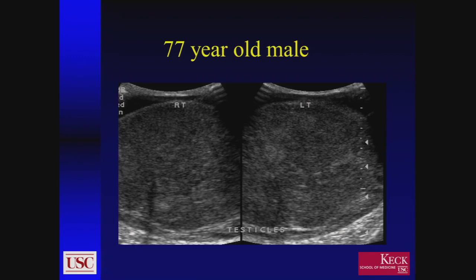And again, the two different types, one which is multifocal masses versus this which is more infiltrating. Obviously, in both cases, you want to go up and look at the retroperitoneum, see if there's any kind of nodes in the retroperitoneum, although the same could obviously be true of seminomatous or germ cell tumors. They obviously also metastasize to the retroperitoneum.